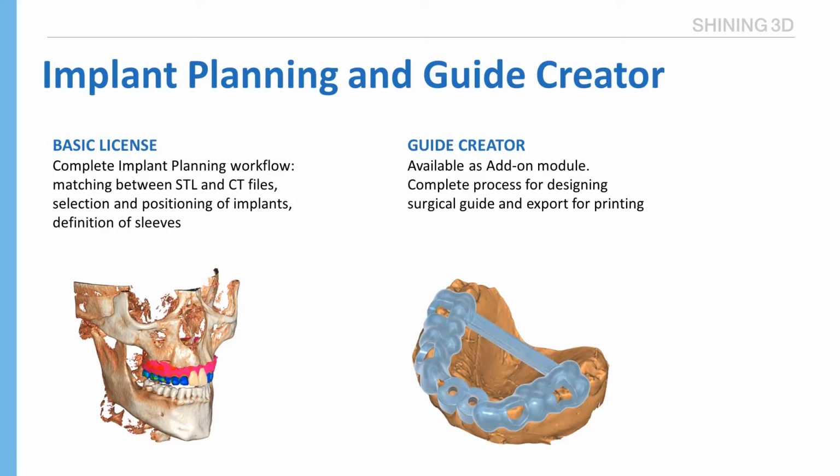Talking about what we can actually do with this software, it is important to clarify that, as it happens with EXOCAD Dental CAD, even for EXOPLAN, we have a basic standard license and then the possibility to add more function for additional tools. More in details, with our standard license, we can complete the workflow for the implant planning based on the match between the STL files and the DICOM CBCT files. And then on the basis of this information, we can define the implant positioning having the most clear and complete information about the anatomy of the patient.